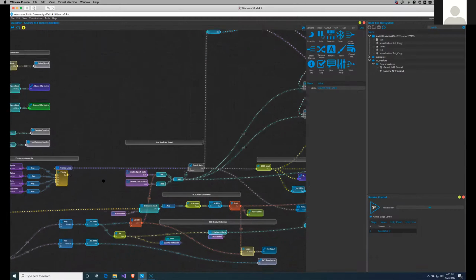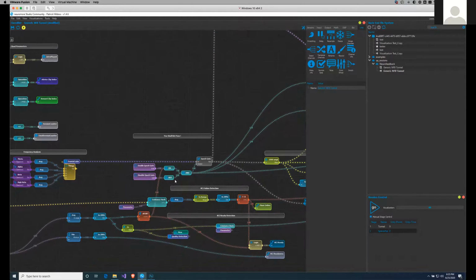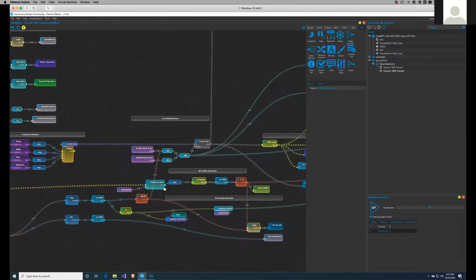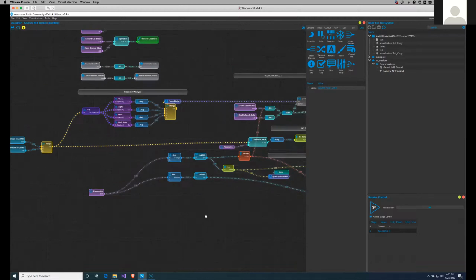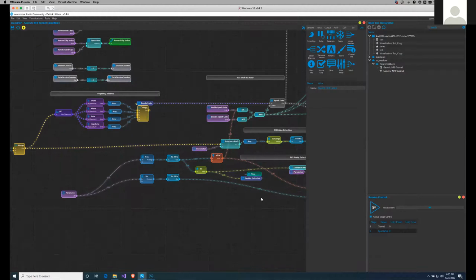Then we have a sample gate around here. It's a pretty basic epoch filter, to see, is the data any good? Is it not any good? And we won't let it through. We detect if the BCI is online. It's currently just hacked here.